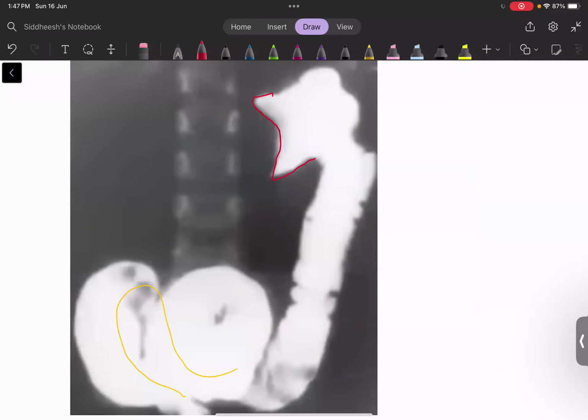So with the help of pressure, what is going to happen? Automatically that intestine that collapsed starts to get uncoiled. So you will notice this type of pattern afterwards, this type of pattern with the barium enema. That means it is resolving now. So this is the treatment also. If you notice your patient is having intussusception, admit the patient, give a pressure enema, and automatically it will resolve.